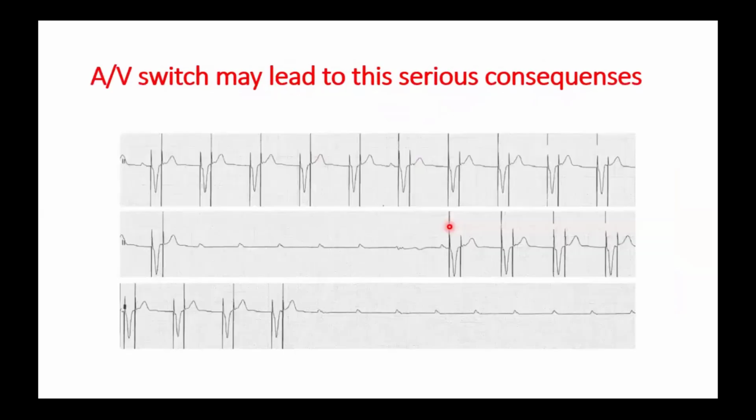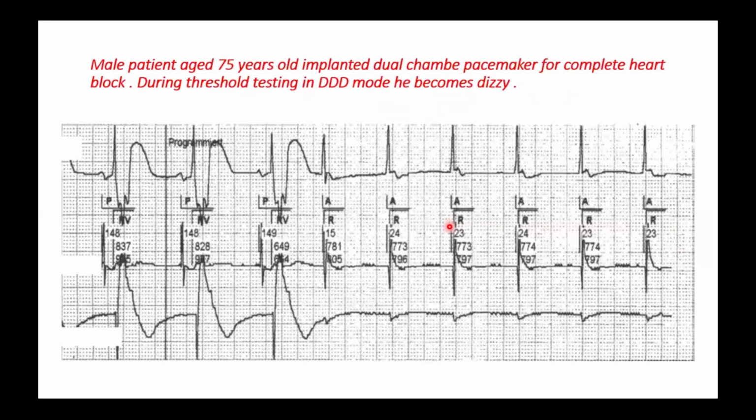So this is another differential diagnosis. This is a problem, but it's very important to know and very important to identify, because it's actually fatal.